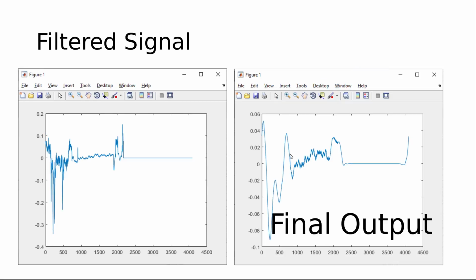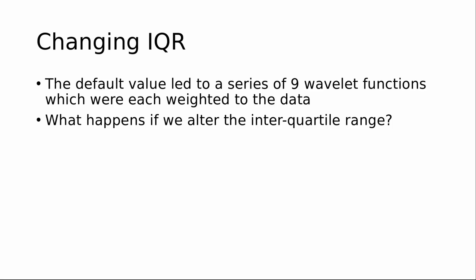So you start with this original filter here, you move it forward, and you arrive at your final signal at the end. You can see that the large peaks have been decreased in amplitude. They've been smoothed quite significantly, and again, whether or not that's correct, I'll leave that opinion to all others. So that's how it works, and again, I apologize for going so deep, but I felt it was necessary, and I hope I got those points correct.